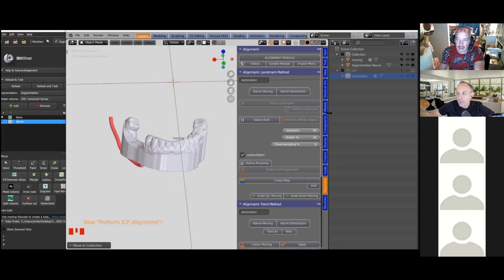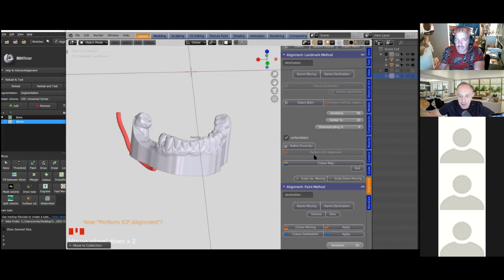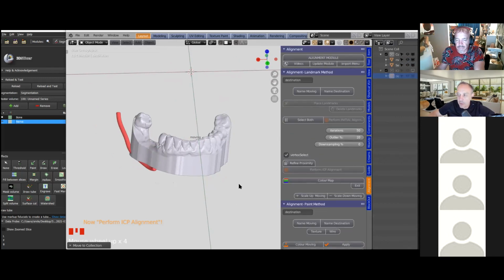So can you explain the purpose of porting this across, like a once-off transfer? Why do we do this? We do that because the porting is easily done with implants, but when you've got a huge model like that, it's going to get clogged up. So we don't want to clog up the system. I have changed the coding a little bit so that you don't actually have to worry about that anymore. It will only take your implants into the porting unless you select it and port it, like I'm going to do in a second.